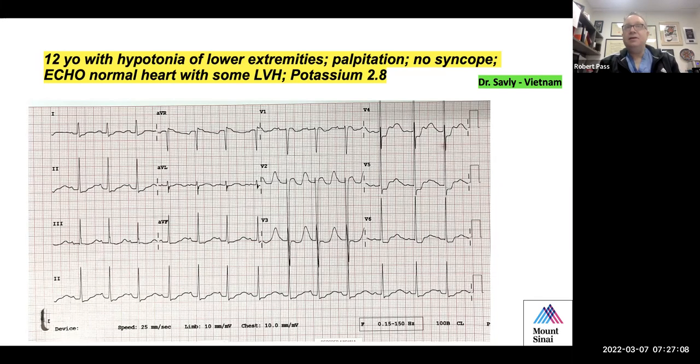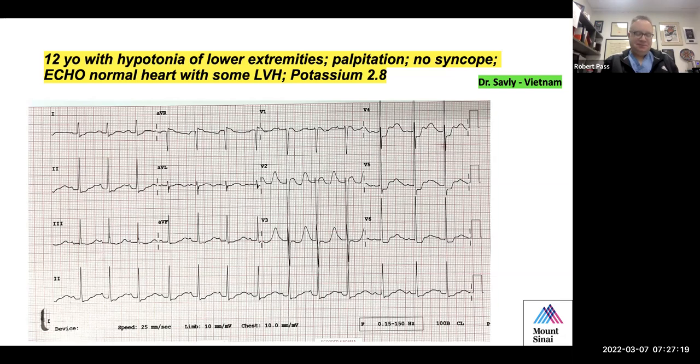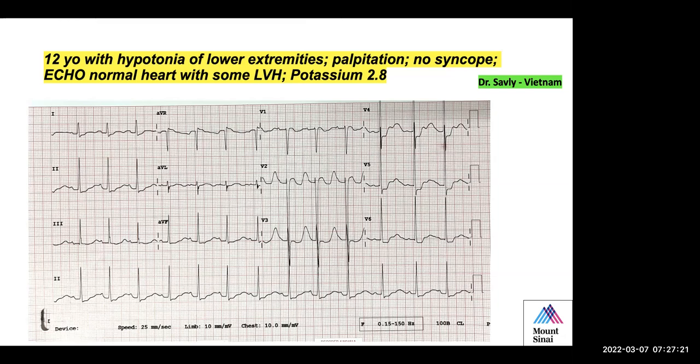Any other observations? What do you think about the QT interval, though? Give me one moment. I'll give you 2. It looks prolonged. Let me see.